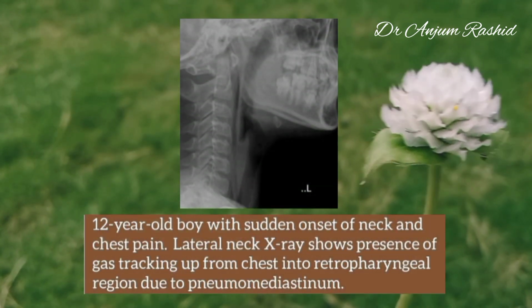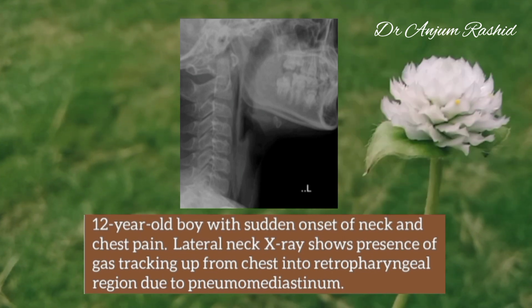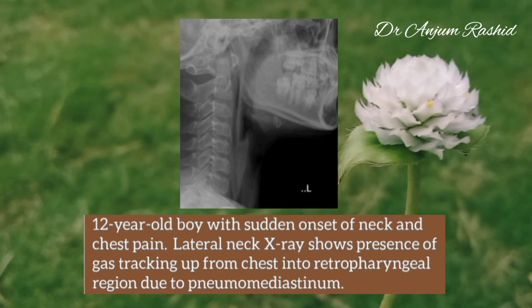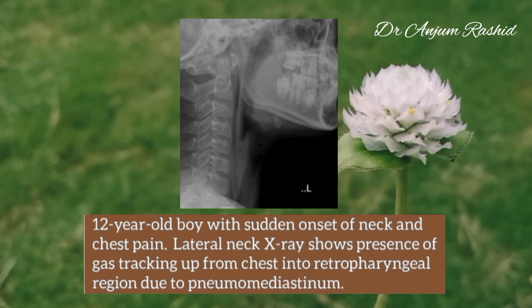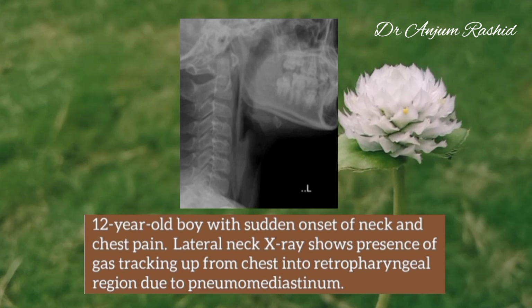Now, here is a 12-year-old boy with sudden onset of neck and chest pain. Lateral neck X-ray shows presence of gas tracking up from the chest into the retropharyngeal region due to pneumomediastinum.